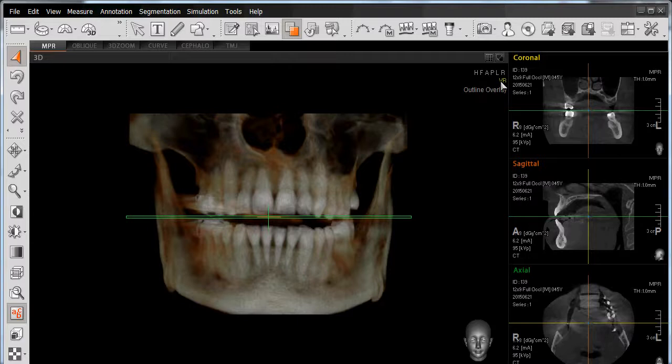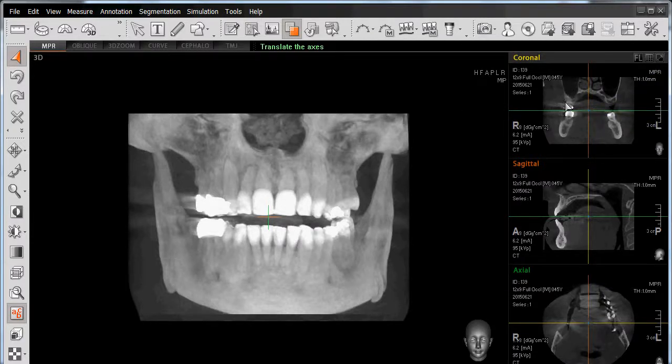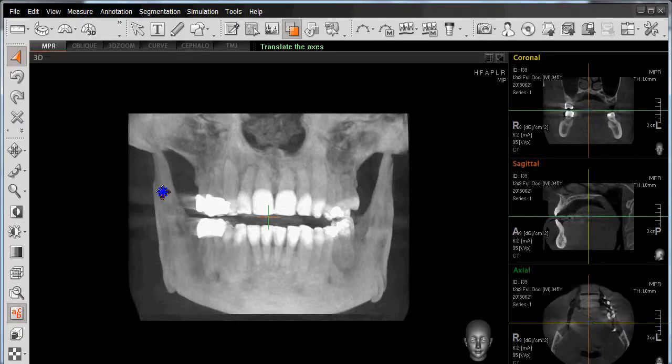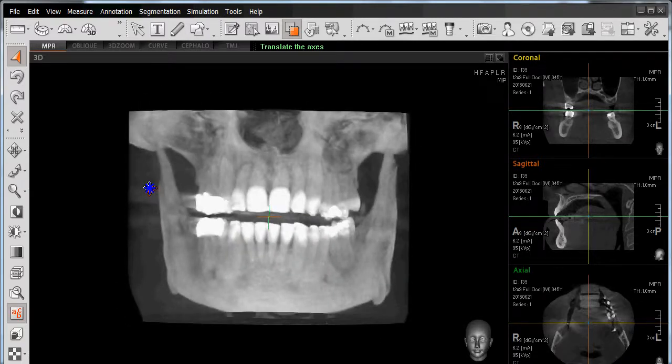In the upper right hand corner, where the initials appear for virtual rendering as VR, left click with your mouse and then left click on MIP. This will then change our view into a grayscale view similar to that of our coronal, sagittal, and axial view. However, we also have the functionality to right click and manipulate the scan just as we did for our virtual rendering.